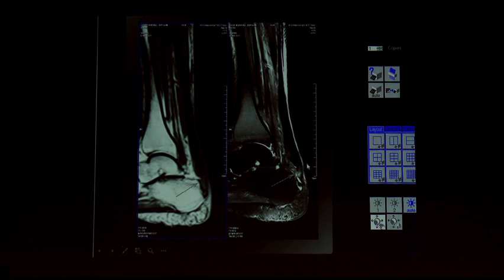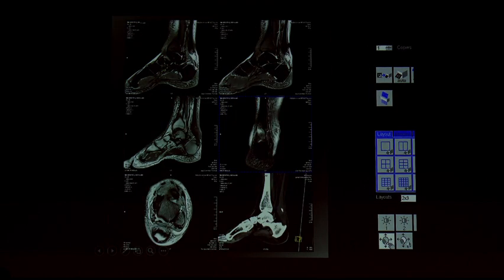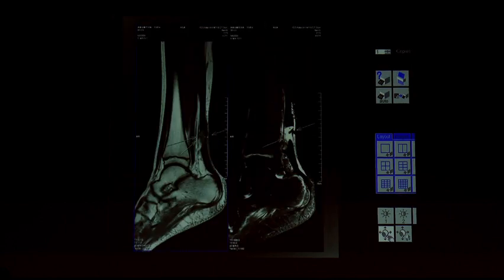And footprint full thickness injury, you can see the footprint full thickness injury, it has gone back, and when it is very severe, you can see how much it has migrated superiorly. To identify the acute or chronicity, apart from seeing the fluid collection and signal changes, sometimes ossification, myositis ossificans or calcification can occur in the retracted tendon. This is one thing which will tell whether it is acute or chronic, or acute on chronic.